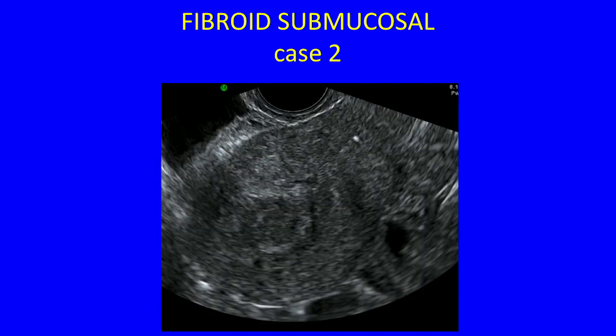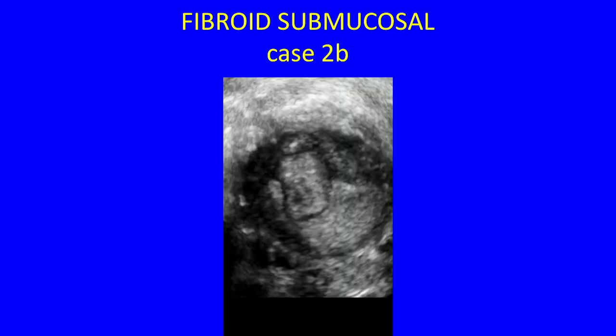This is a separate case. I can see the endometrial cavity and something within it, but again, exactly what the relationship between the fibroid and the endometrial cavity was is unclear. It's very much something that gynecologists want to know: not only where the fibroid is and how large it is, but how and to what extent it alters the endometrial cavity. Here on 3D, you can quite easily see that this is the fibroid, this is the cavity, and look how it's indented by it. You can work out whether more than or less than 50% is indenting the cavity. It's all useful information.